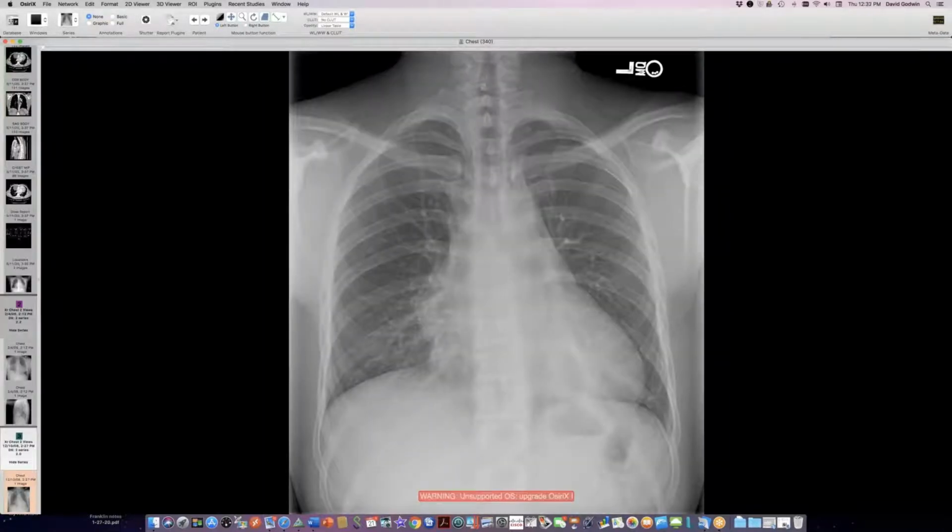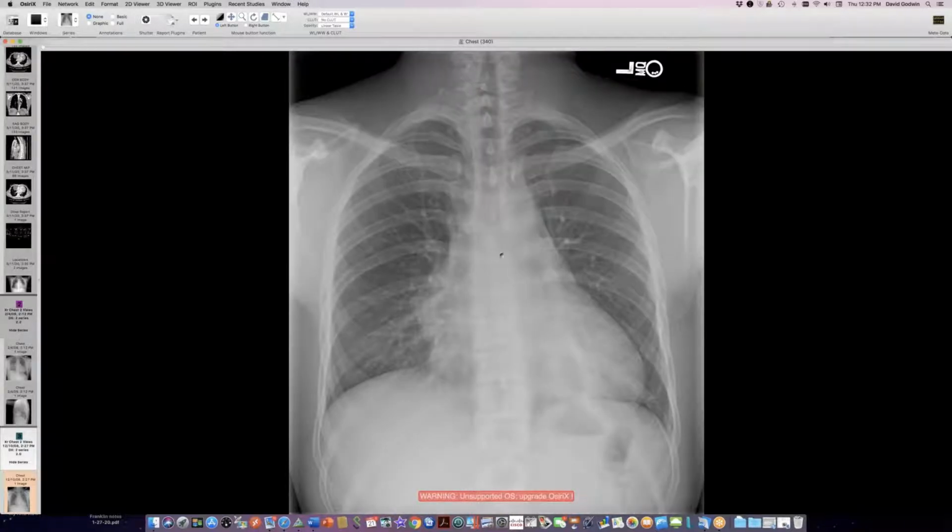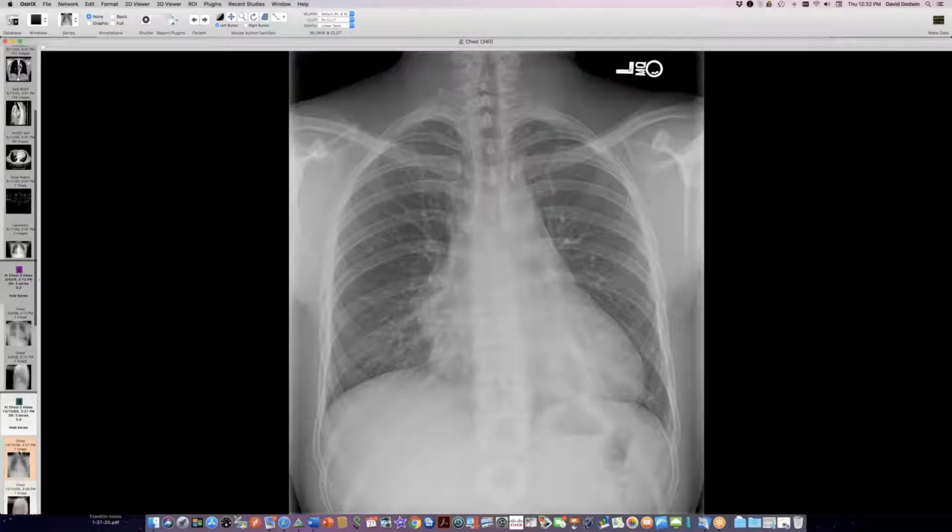Wow. And then this is a person who has this ancient radiograph from 2008, and it does show this subtle mediastinal convexity down here. The lateral shows maybe some fullness anteriorly there. It's a little hard to evaluate up at this higher level. This is a fairly young patient, and the heart looks kind of big here for a young patient, but I think actually a lot of this is not really heart, it turns out.